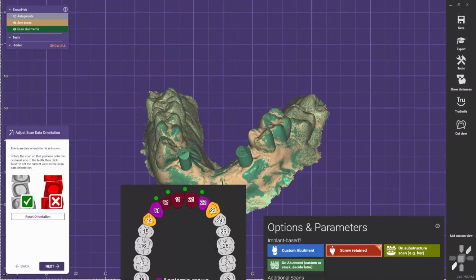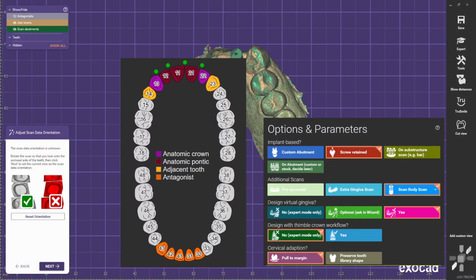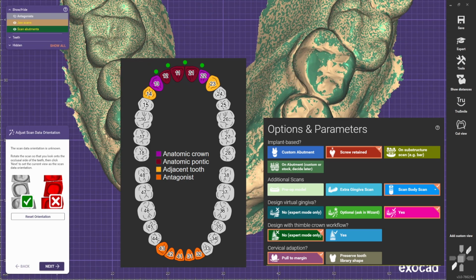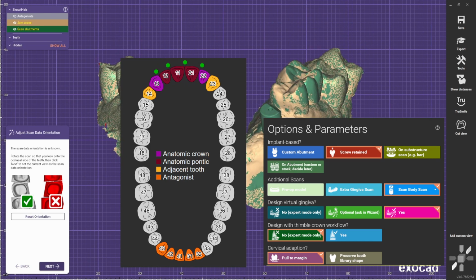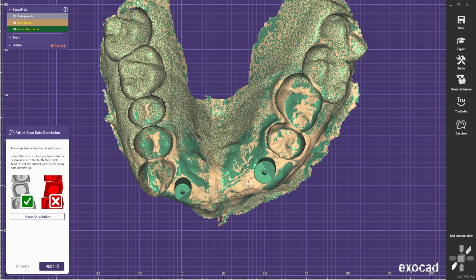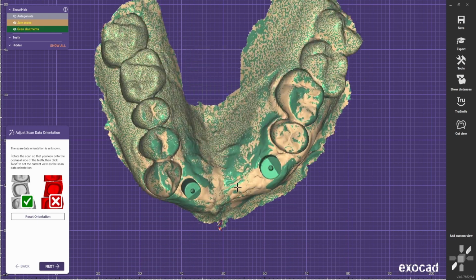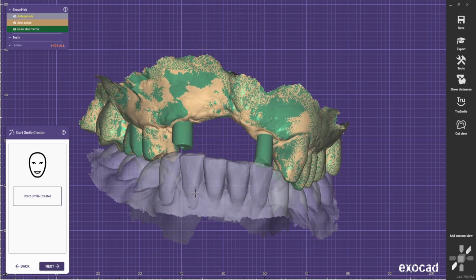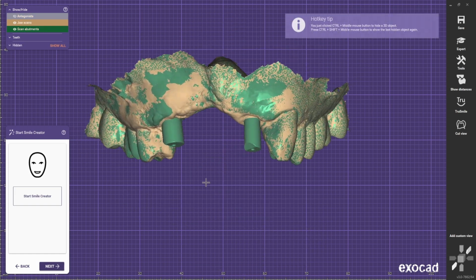Today we are going to do a 5-unit bridge. This is an implant case, and the purpose of today's exercise is to do a 5-unit bridge with pink with the generic library and modify it to look like old and damaged teeth. So we don't have a pre-op today.